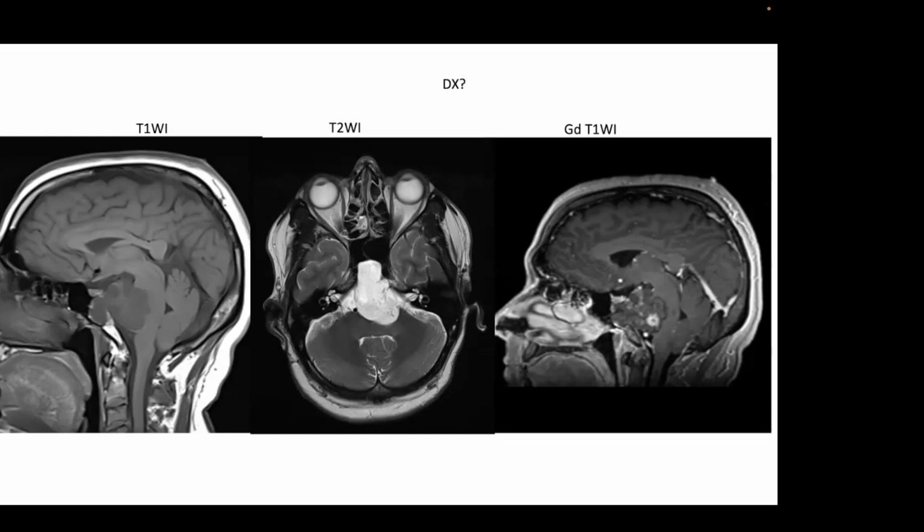For example, when we differentiate the two types of hydatid disease, it can be regular hydatid disease or the alveolar type. So when there are multiple cysts that are invading the other structures around, on the post-contrast examination, there are small lesions that are all grouped together and invading the structures around.